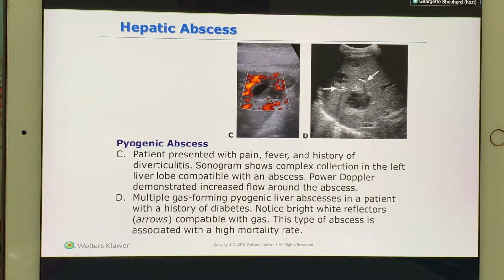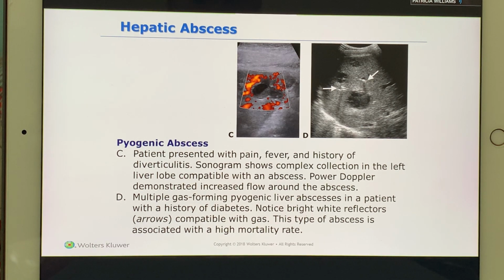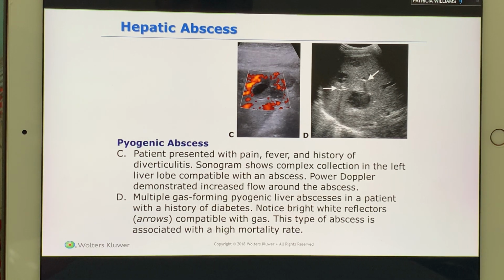This type of abscess has a very high mortality rate because of gas inside the biliary system. So this is called a pyogenic liver abscess with gas.